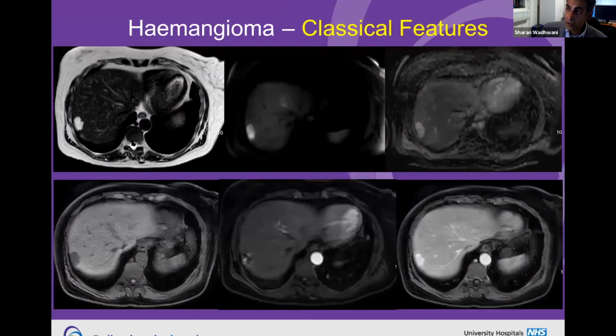The two lesions that we've got in that liver, that I did vaguely point out, are these lesions. They're representative here. So here's a T2. Very uniform, lobulated, very easy to draw the edge around. The diffusion, it's there again. The ADC, which is a derivation from the diffusion, and it's bright on that as well. Classically, the hemangiomas will be, okay?